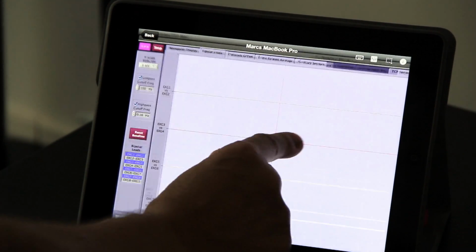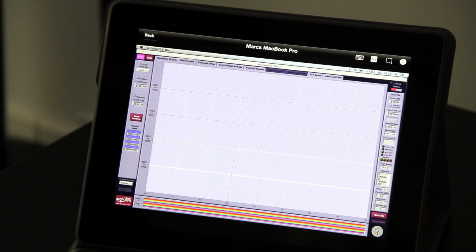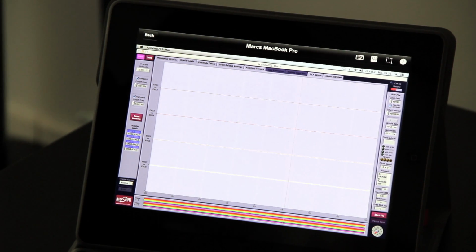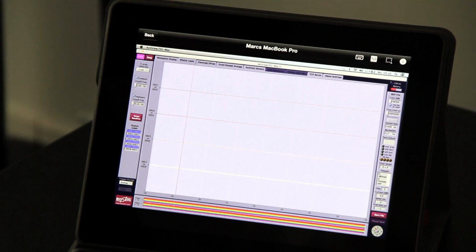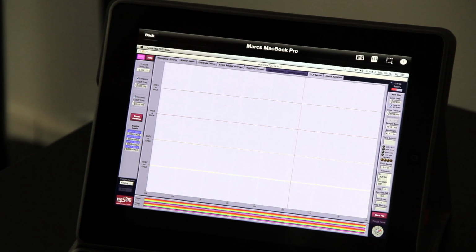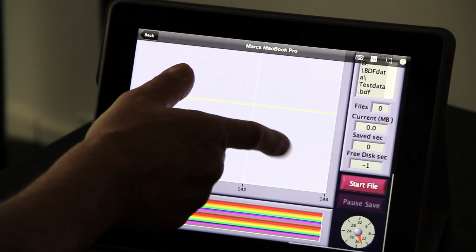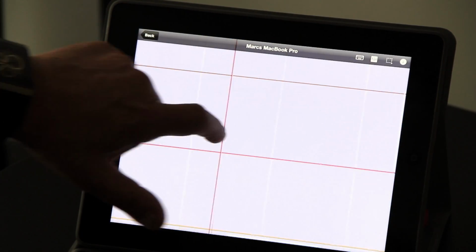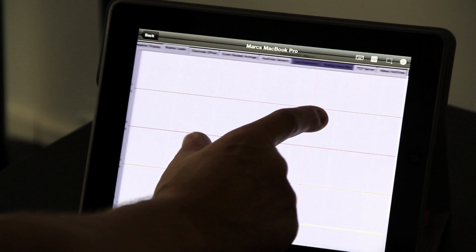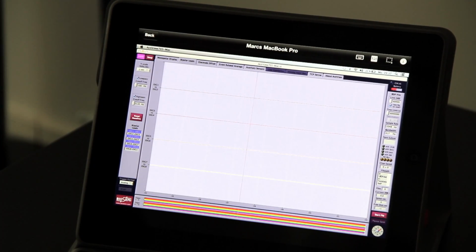So that's all very, very nice. We have complete functionality, including zooming in and zooming out on an iPad, obviously not on an iMac or on a MacBook Pro at the moment, because there is no touchscreen. But on the iPad, it's all very beautiful. We can zoom in, we can check all the things in complete detail, and that's, I think, a very powerful and very beautiful feature that we can run.